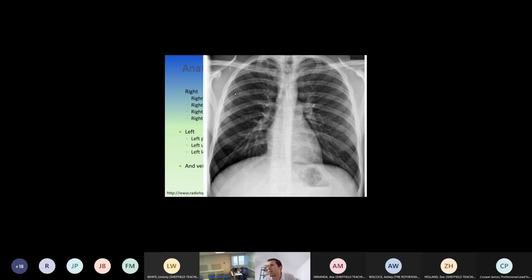So you're paying attention to certain areas when you get certain clinical histories. I'll pay more attention to the bones if someone comes in with trauma and I'm looking for rib fractures, for example. So I'm just tracing the outline of all the ribs, both posterior ribs and anterior ribs. When we see rib fractures, they mostly fracture on this lateral aspect down the side.